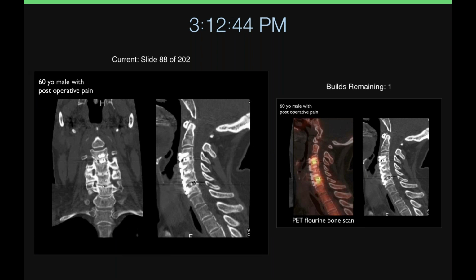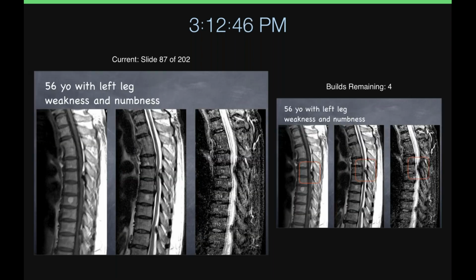Probably calcification. I see that again? It's a huge one. Yeah, it's very focal. Yeah, very focal. Big, yeah. Maybe another one lower down, yeah. There's another one down here too. Yeah.